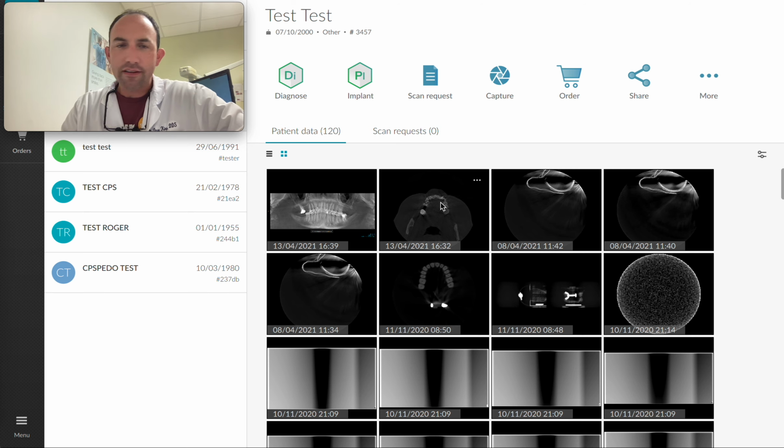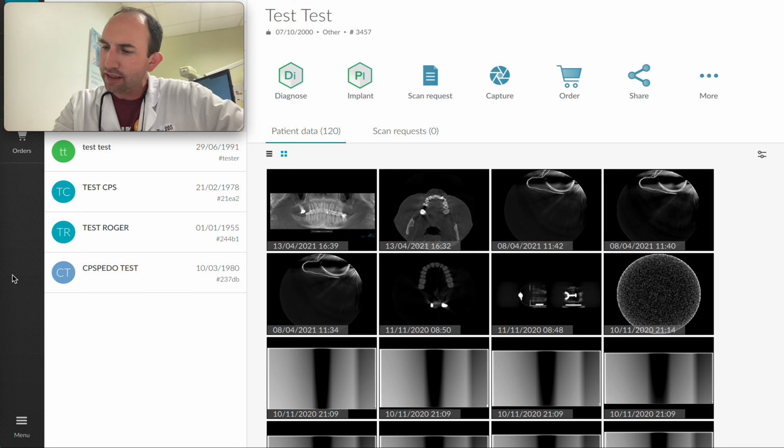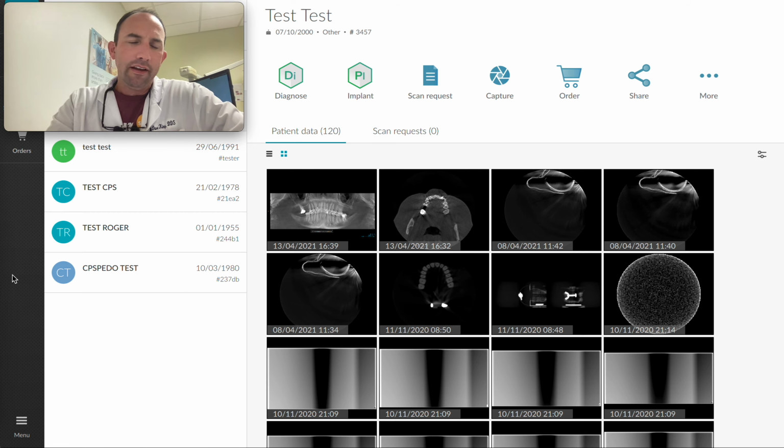What we'll do next is go over to the actual file that we get back. Uploading to Beam Readers, there are a couple of QRGs. It's very, very simple. There should be a walkthrough on how to upload it on the CBCT landing page that was referenced in the email that was sent over. You navigate to beamreaders.com and set up an account.